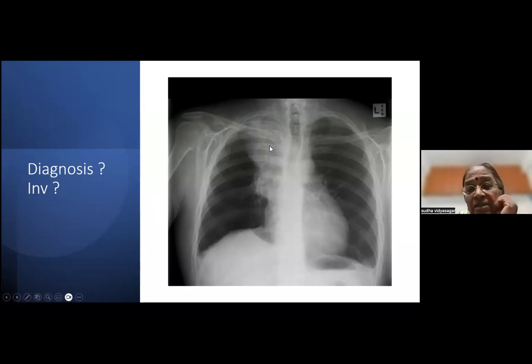You would think it's a malignancy simply because this thing is not wedge shaped or nicely cut off, nothing like that. It's a segmental consolidation, if at all, but we don't like that bulge. That bulge is something definitely that cannot be ignored, and we have to call it a malignancy. Unless you disprove it, you will never call it anything else.